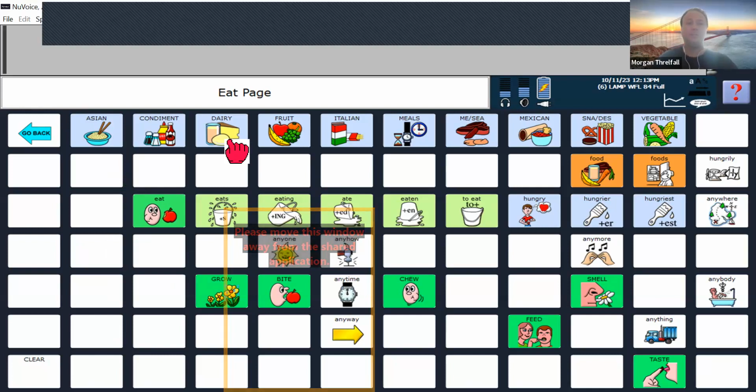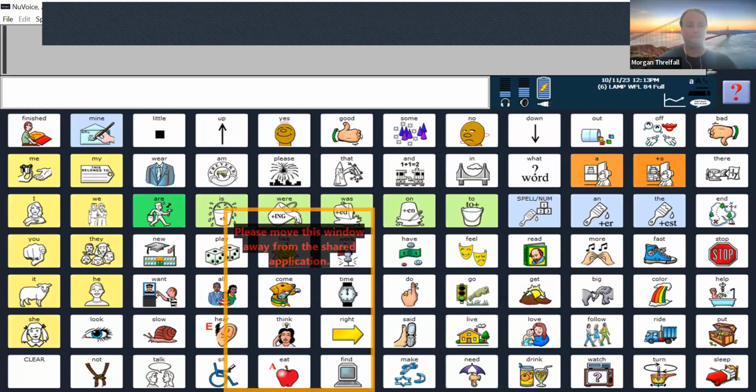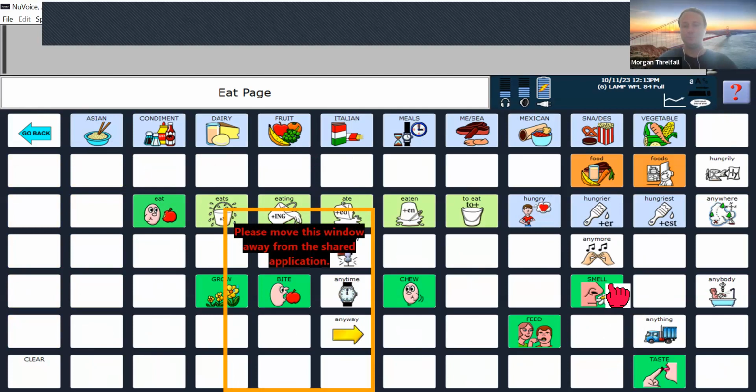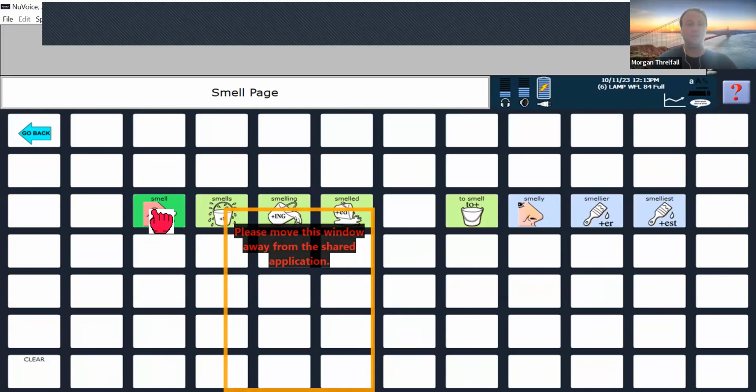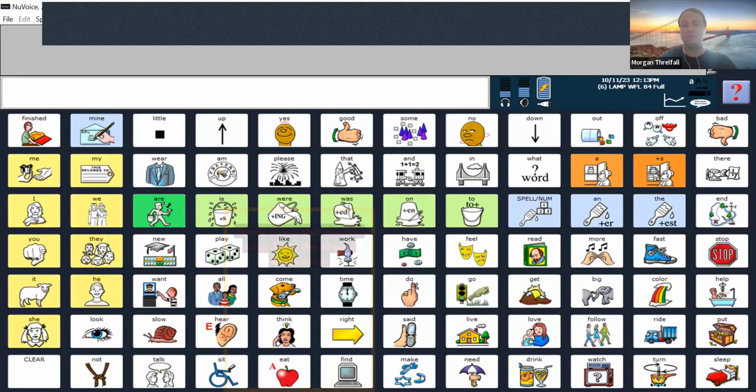Here we've got some buttons that have capital letters. So our blue icons in capitals will be a category of nouns, and underneath that will be more nouns. We've got some green icons in capitals, and this will be a page of verbs. This is a verb category, so I've gone underneath. We've got our main verb, our verb conjugations for that verb, moving across to the adjective. And that's how all the buttons are organized.